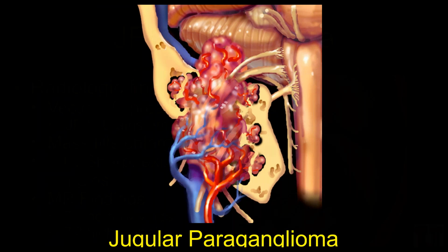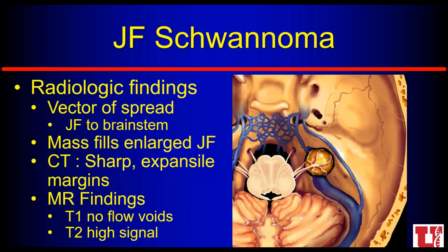Now we want to differentiate a paraganglioma from a schwannoma. So with a nerve sheath tumor like a schwannoma, we think about where 9, 10, and 11 are going over to the jugular foramen. So our vector of spread with a schwannoma is up towards the brainstem. So it'll be down into the carotid sheath or space inferiorly, and superiorly, it should extend along 9, 10, and 11 towards the medulla and the brainstem up higher. So here we're going to have a mass that's filling the jugular foramen, and we have sharp expansile changes to the osseous walls.